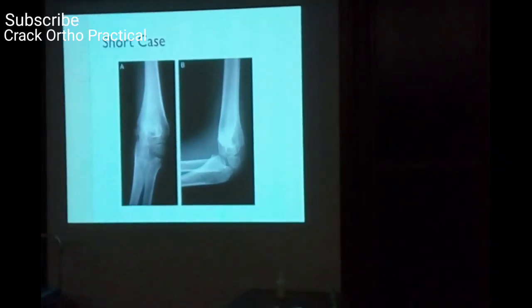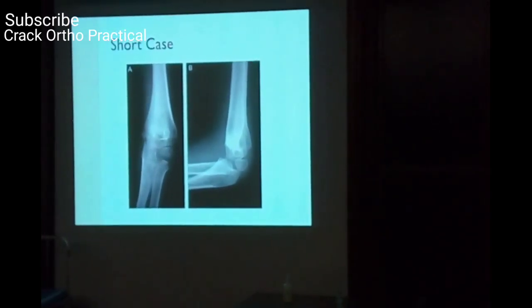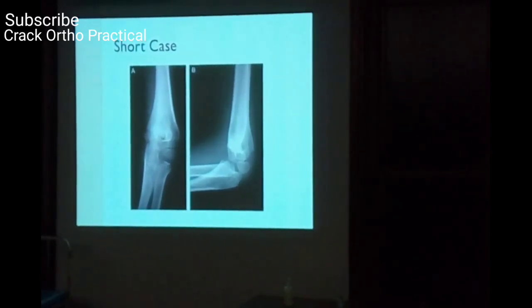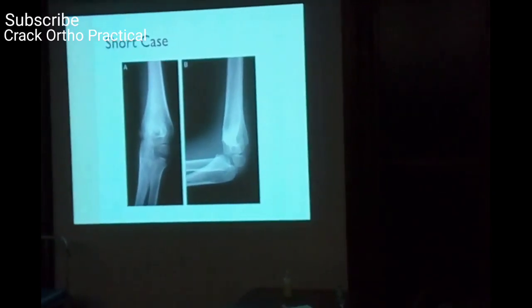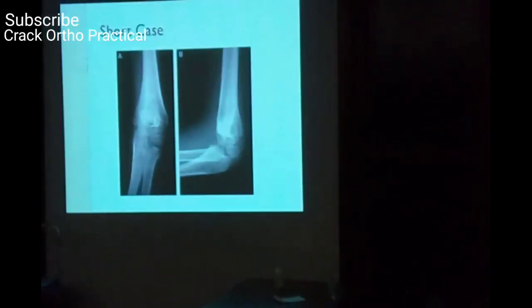So basically, whatever clinical findings you can see in the X-ray, you just have to say that they are there. So these will be covered anyway in your long cases and short cases. But if you get stuck like this on a cubitus varus X-ray, then it will be a tough job. Right? So, any rotational deformity, can you comment on it depending on both these X-rays? I can't comment. You can't. Anybody?